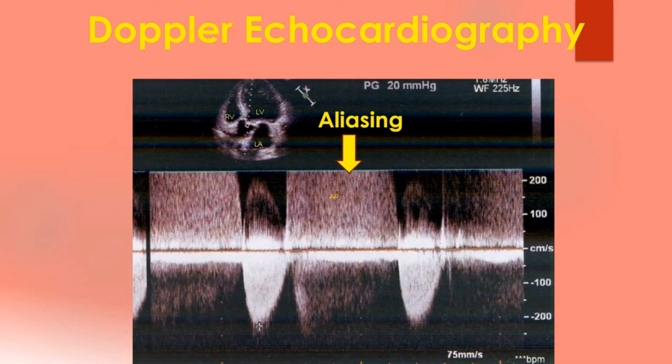In such situations, continuous wave Doppler with higher velocity range is used. An intermediate option is HPRF or high pulse repetition Doppler. Disadvantage of continuous wave is that it cannot pinpoint the exact location of the high velocity signal as it is continuously transmitting and receiving echo signal.